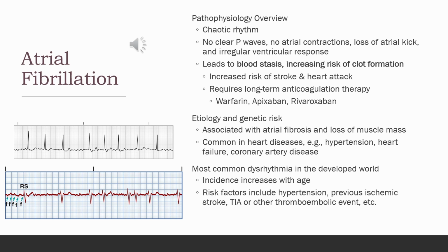typically with an RVR response, again, that rapid ventricular rate, it can be anywhere from 120 to 200 beats per minute. But otherwise, we can have atrial fibrillation that's still got a controlled rate, where the ventricular rate is less than 100.